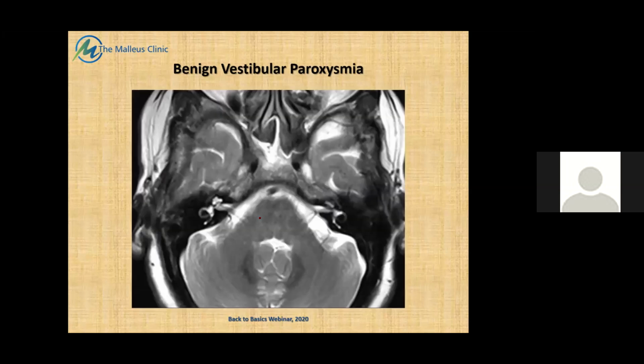Now, this is a case of bilateral vascular loops coming in close proximity to the 7th, 8th complex, though this patient actually had symptoms of the loop compressing onto the left side rather than the right side. But then this is another dilemma, especially when surgery is being recommended, though it's not as popular as it used to be earlier. Jannetta, Møller, that's the group that had been a strong advocate of microvascular decompression for this particular problem.